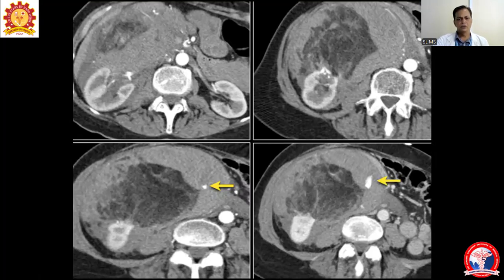Now here we are seeing angiomyolipoma, which is important when it is more than 4 centimeter in diameter. Why is it important? Because it is rich in vascularity and there is a tendency after 4 centimeter to bleed. So here again we are seeing a large angiomyolipoma, but here there is a change. This is fat density. Contrast is given in this patient. All images are contrast enhanced images. How to confirm: the aorta is showing dense signal because of iodinated contrast, and the vessels are also showing dense signal.